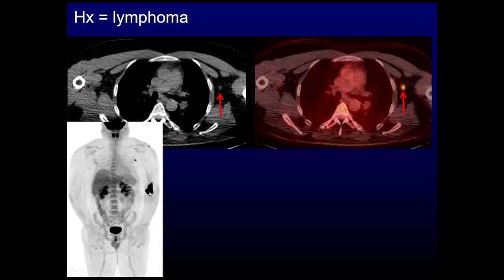And then that extravasation travels through the lymphatics and accumulates within a node within the axilla. So in a sense, we did a sentinel node exam of the arm. Right? Normally, we inject some radiotracer into the breast, and we see which is the first lymph node which drains the breast. Here, we unintentionally injected the arm soft tissue and identified the sentinel node draining the arm. So this doesn't necessarily represent malignancy in this node. It's just the draining node at a site of extravasation. So be wary of extravasation causing false positive nodes.